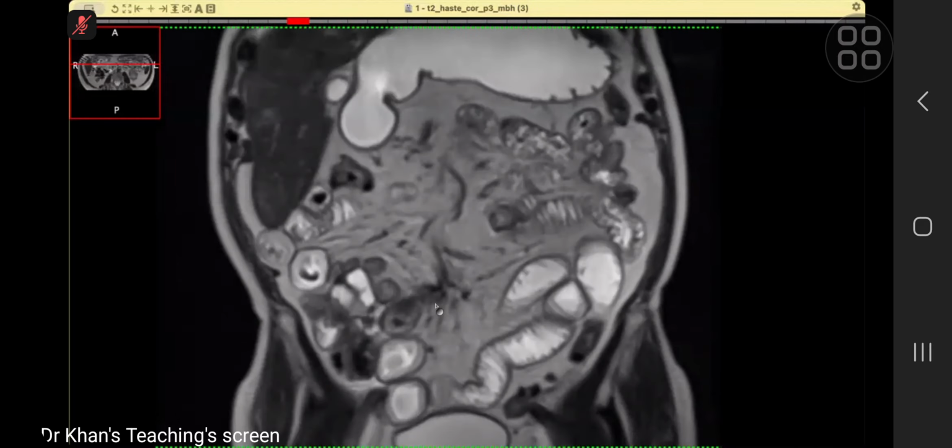So carcinoid is a very important exam case, and satisfaction of search is very important. I've shown you two different cases where, whenever you get one, you tell the examiner, I am looking for multiple lesions. They can be at multiple locations. Number one, I am looking for any hepatic metastasis. So this is carcinoid.